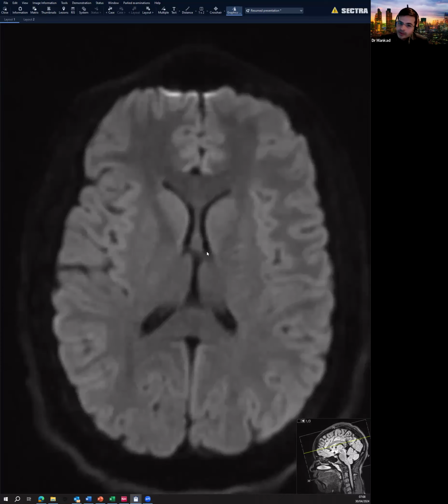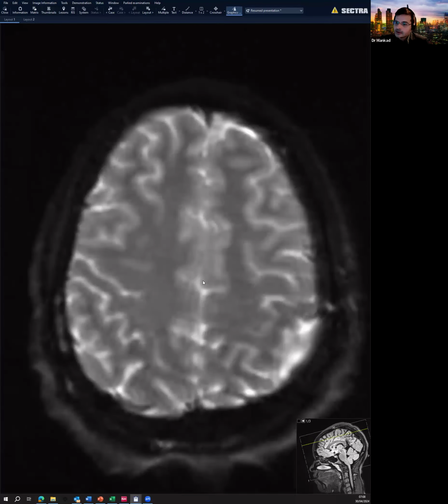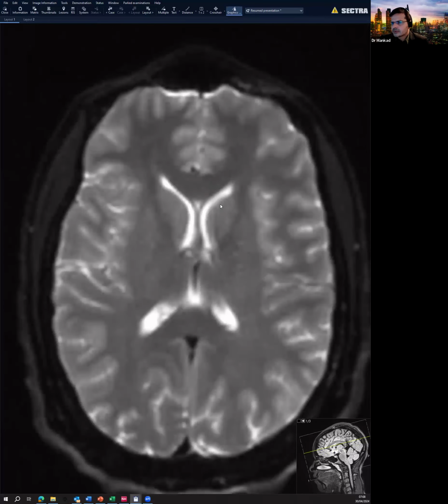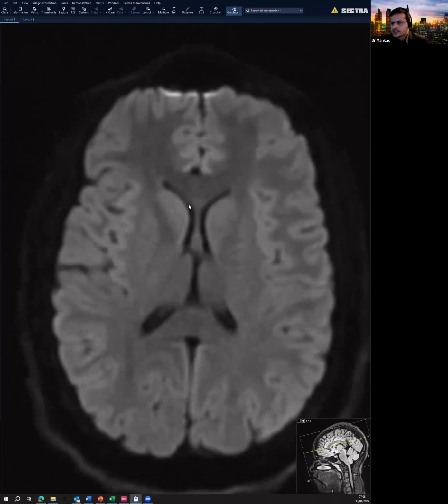Okay. Now, the way diffusion weighted imaging is acquired is it gives you instantly two different parts. So you will see the scan and you'll see the sequence. You have this particular image where the CSF looks bright, and then you keep scrolling through the same sequence and you encounter this, where the CSF is saturated out. Diffusion weighted sequences are acquired at different b values, so it's called B0 or B1000, and some centers even do intermediate or higher values.